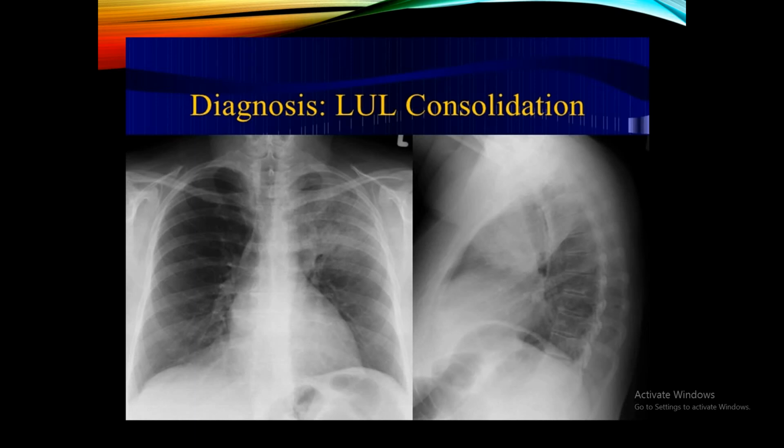الخطوة التالية هو localization of the lesions. From the PA chest X-ray يلاحظ أنه left cardiac border is clearly seen. إذن اللينجولا is not involved لأنه lesions باللينجولا مفروض يعملن obliteration of the left cardiac border. إذا تلاحظون أنه من PA chest X-ray أنه left dome of the diaphragm is very clear. إذن lower lobe is not affected. فإذا من PA chest X-ray this lesion is mostly in the left upper lobe.